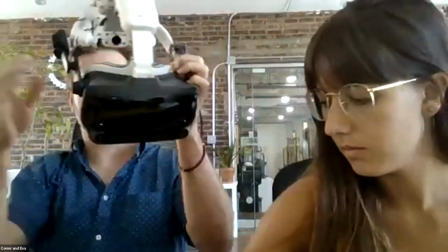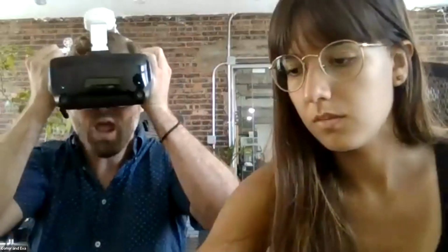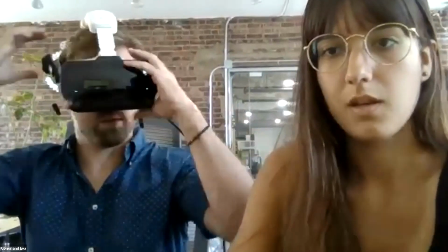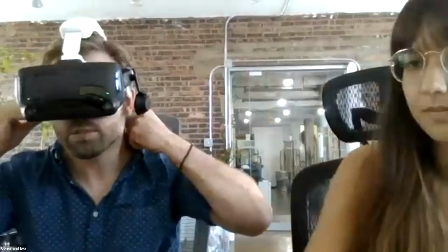We'll go out and around. Going in. Okay. Got the ear clips.